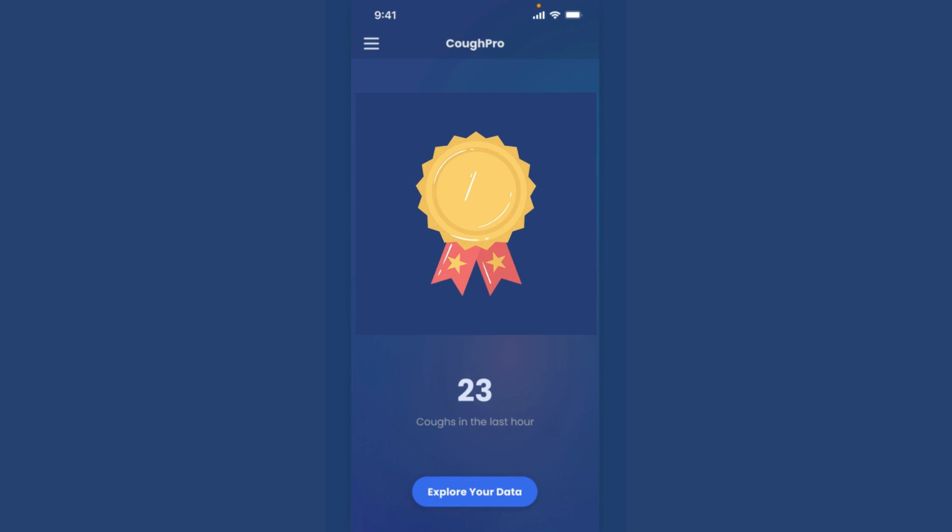Congratulations! You've now gained a comprehensive understanding of the cough report feature in CoughPro. If you have any questions or require further assistance, please don't hesitate to contact our dedicated support team.